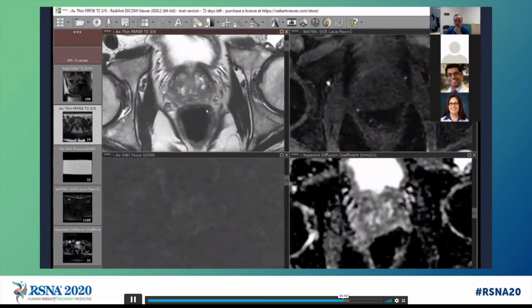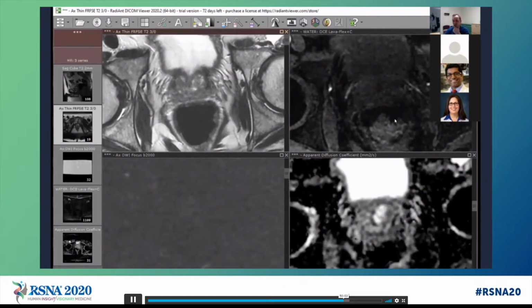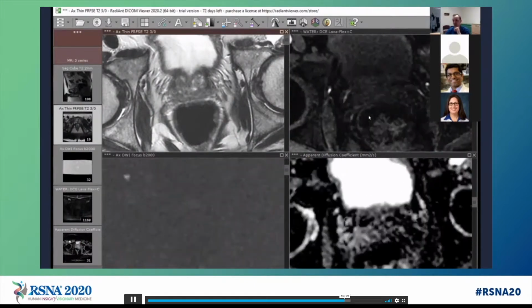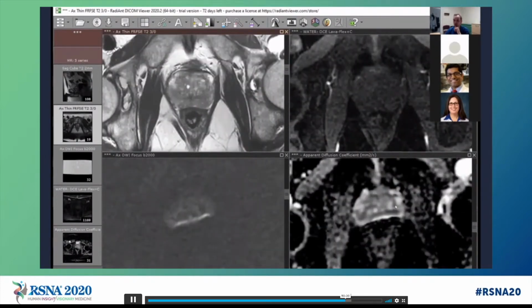Now, what you can see is that there is some rectal loading here, and actually it's often better depicted on the T1, where you can see what is fecal matter and what is air. Typically rectal loading can cause spasm, particularly if you don't use anti-peristaltic agents, and that can cause a lot of motion on the T2 weighted imaging. But air is the thing that really causes problems with the diffusion weighted imaging. If you've got this rind of air here, as we do in this case, you can get a lot of distortion and warping susceptibility artifact affecting the diffusion weighted imaging, essentially making it not really of diagnostic value.